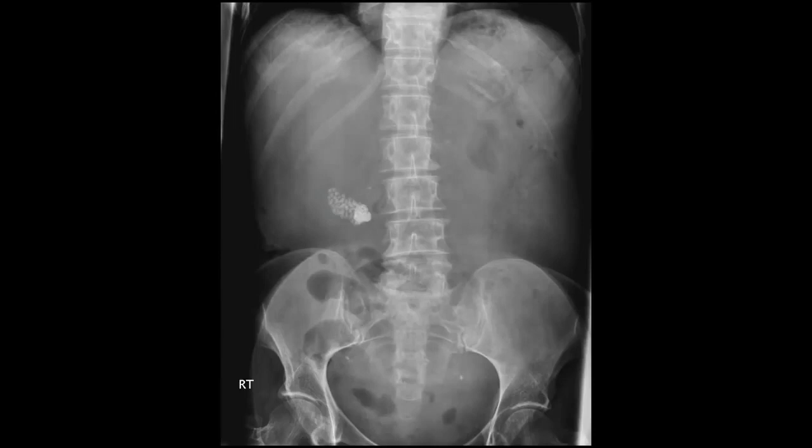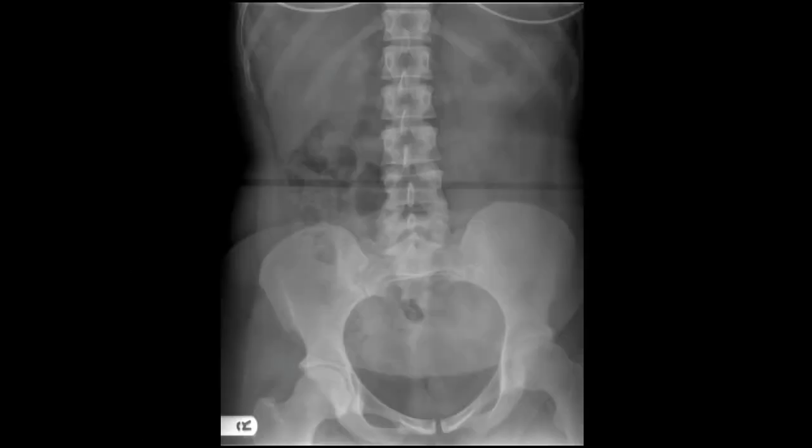Yeah. And bowel gas pattern again looks normal. You can see very little in the large and small bowel, so that's normal. Okay. Then that's just showing you the gallstone. C for calcification. And the next picture here we have got is another, so A, B, C, additional opacities. So if you look at these bra wires, these are artifacts, and there is a laminated opacity in the right upper quadrant. This is again gallstone, cholesterol gallstone, usually solitary, laminated, big one here.